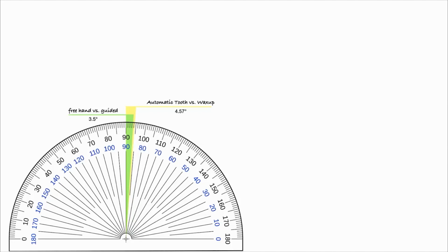In other words, it's from a library of teeth that you can just drop into position without reference to occlusion or maybe gingival aesthetics, compared to implant position that we would look at based on a full diagnostic wax up. And this is based solely on the digital plan. This is not based on the implant placement, approaching 5 degrees.